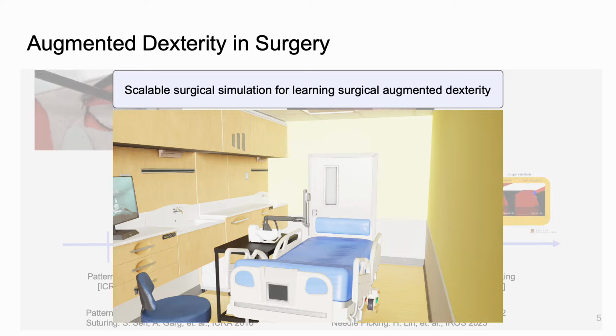Surgical environments are in fact difficult to simulate due to the complicated interactions of rigid and deformable components and restricted arm motions. Our efforts focus on development of a surgical robotic simulator that imitates reality much faster than real time, supports contact-rich physical interaction and high-fidelity rendering to bridge the visual sim-to-real gap, has access to robot learning frameworks, and is able to record human expert data for policy learning and run successfully on physical platforms.